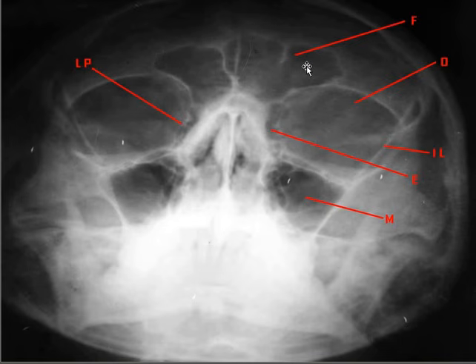This is a frontal sinus with scalloped margins, which are normal. Scalloping may be absent when the patient has mucocele of the frontal sinus. This is lamina papyracea, and you have to look for the ethmoid sinus medial to lamina papyracea. And this is the nasal septum, which is thickened, and there is DNS to the right side in the upper part, that is high DNS, high deviated nasal septum.